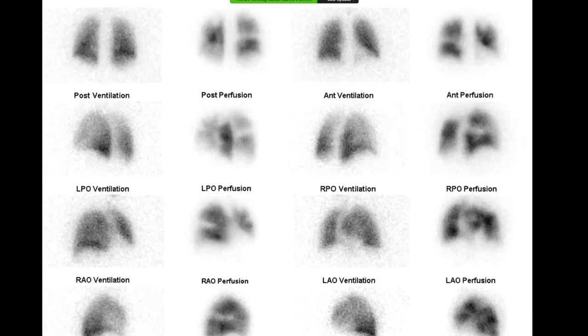In the hilar region, because of the pulmonary arteries and veins, you would have an overlapping of those vessels, and there could be a little bit of asymmetry in the central portion of each lung, which is basically artifactual because of the overlapping and some trapping of the perfusion material in that site.